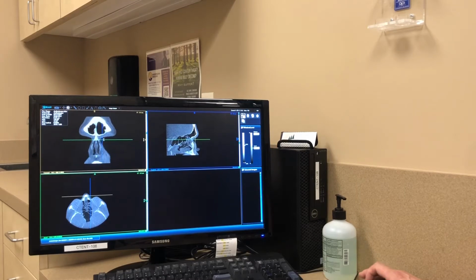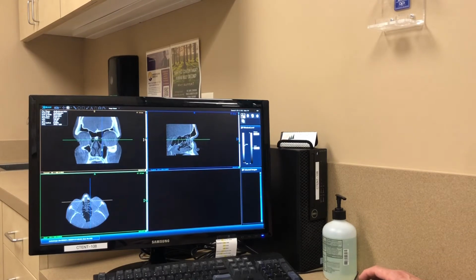So I'm going to get to the very front of the nose, okay? So this is the very front of my nose. And as we go back, we get to the forehead sinuses. These are the first sinuses that we're supposed to see. Sinuses are black. Black is air on the scan. You can see air all around my face. Bone is white, and soft tissue is gray. And so as we go back, we can see these forehead sinuses. They're black. And as we go back, we can start to see the eyes right there and right there.